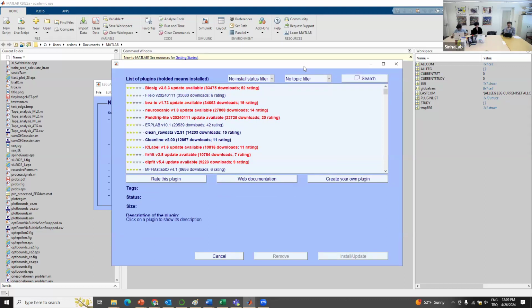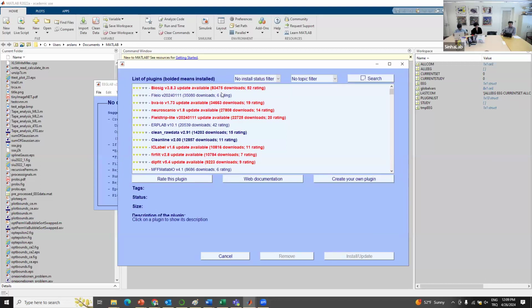The display we're using in the lab is showing some signs of sickness because it gets dark, and then I can't see the screen. But anyway, what I was referring to a minute ago is that if you go to this extensions tab, you will realize that there are a lot of plugins that you are able to download and set up within the EEG Lab framework. And some of them are already there.